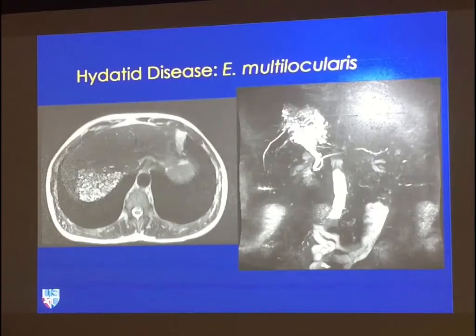Instead of having a dominant cystic lesion, which may or may not have peripheral daughter cysts, you have these little alveolar cysts, so little tiny bags of cysts. Oftentimes they're in the right lobe of the liver in a subcapsular location. When something looks like this, it's not specific for us. We'd be concerned that this is a cystic tumor, whether cystic metastases or a cystic primary hepatic lesion. Oftentimes the margin of these lesions is infiltrated and aggressive. So this would be a tough diagnosis for us to make solely based on small, tiny, aggressive-looking cysts.